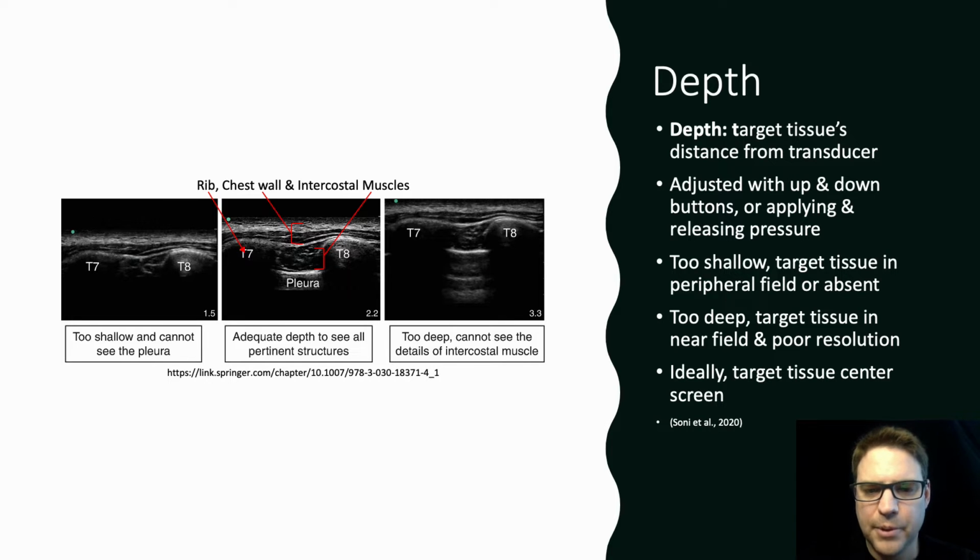When performing a lung POCUS exam, it's essential that high-quality images are captured. Missed or inaccurate diagnoses may occur with suboptimal imaging. Selecting the most appropriate POCUS setting for a given exam helps reduce poor image quality and diagnostic errors. Two of the most common ultrasound settings that need adjustment are depth and gain.